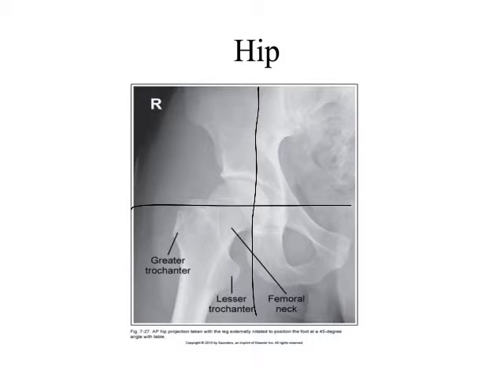Now, as simple as that sounds, is it easy to center on the hip every single time? No, it's hard. So even though it's easy to say it's centered on the hip, we know that doing this position is difficult. Nevertheless, we need to have words that say it's not centered, right? It's not collimated appropriately. So that's what I'm trying to encourage us to do. But this is centered on it.